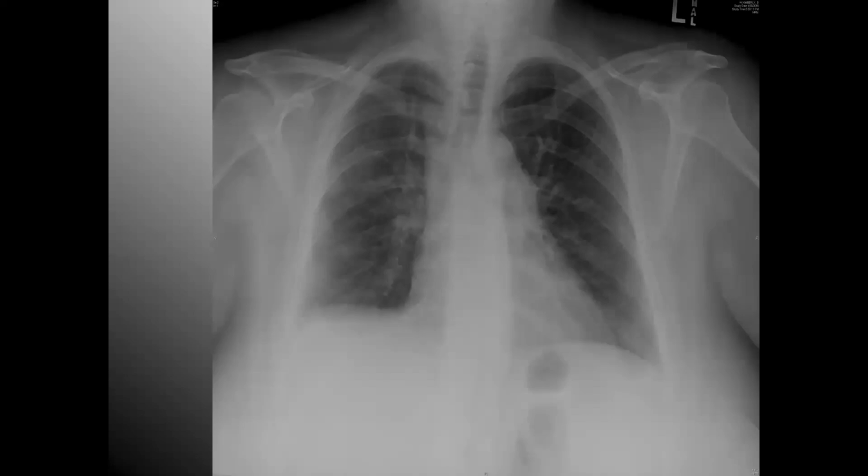And so without belaboring each one of these, because I've got to watch our time as well. We've got a little bit of time left, but quite a few to still go over. Just stay with your quick systematic approach. A for airway. I can see at the top it's not quite midline, but by the time I reach the actual thorax, it's fairly midline with maybe an arguably slight tortuous twist here towards the right-hand side, just ever so slightly. You can clearly delineate the carina and even see one of the main stem bronchi here on each side.